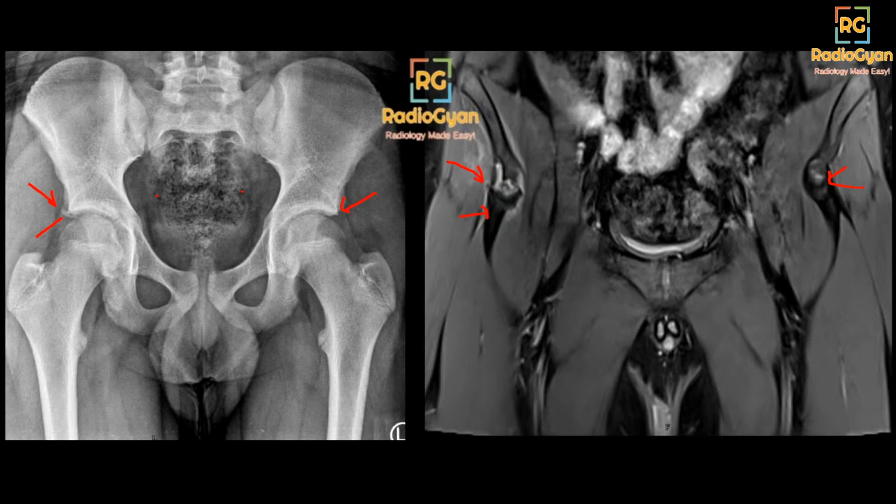In fact, we had this case on our website, and it was Dr. Allah who pointed out a mistake in the diagnosis that I had put up. So I thank her for doing that. I had mistakenly mentioned that it is an anterior superior, I think, but she corrected it to anterior inferior iliac spine. So this is an avulsion fracture of the anterior inferior iliac spine.